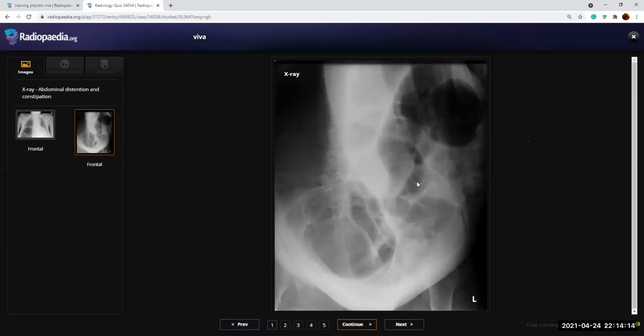So what is your diagnosis in this? Basically, it's colonic obstruction due to either a CA or an incarcerated hernia. Basically a strangulated hernia. Why did you come up with hernia? You said the hernial orifices were clear. No, I said I couldn't see any hernial orifices clearly, actually. So would you still comment about that if you're not seeing the hernial orifice?